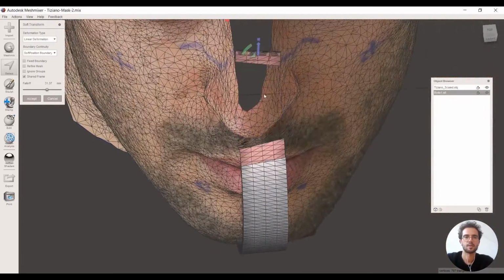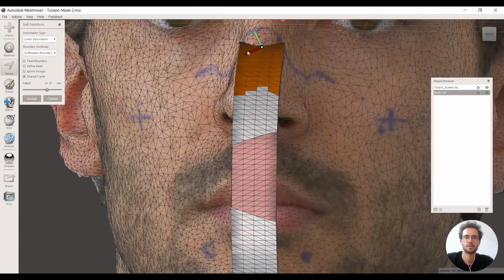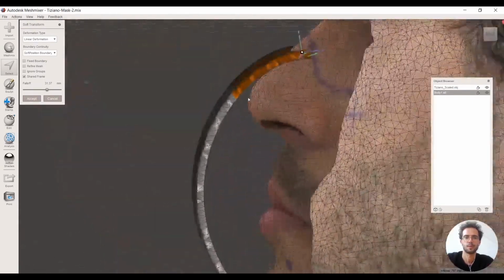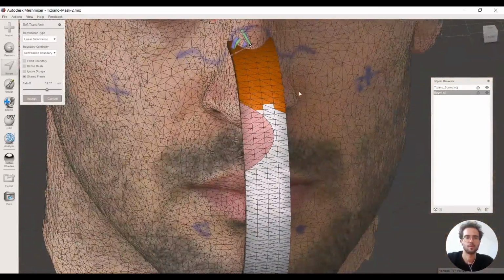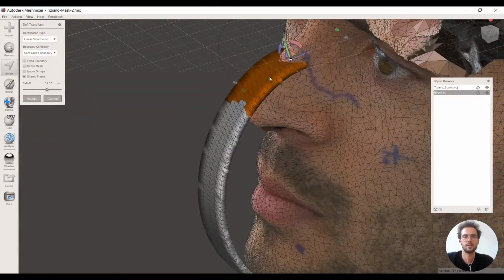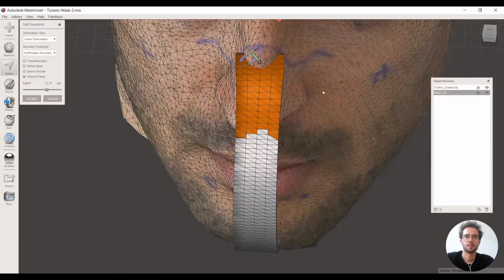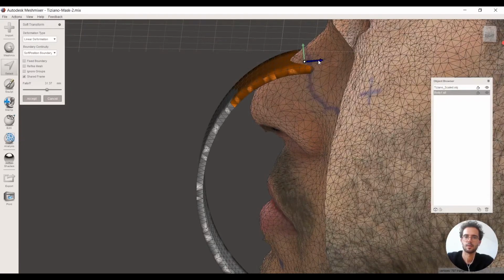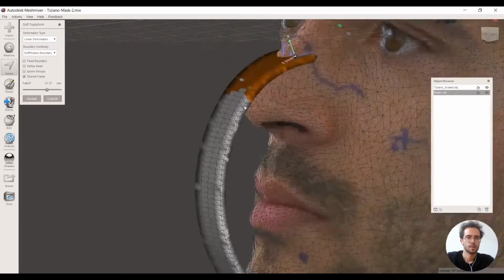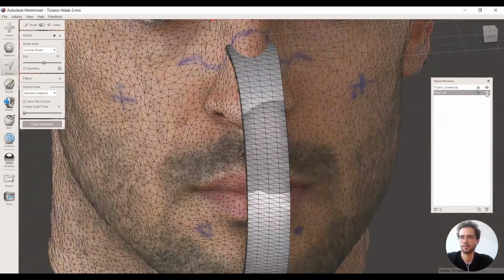And as you can see, it's easy to start deforming a little the part, but we don't care too much because we're gonna do a kind of really organic design. This is not so good, but we can start this way. I want just to catch the middle of my nose and go a little inside the nose for the moment. We can also scale it up a little bit. Okay, and down a little. Okay, accept.